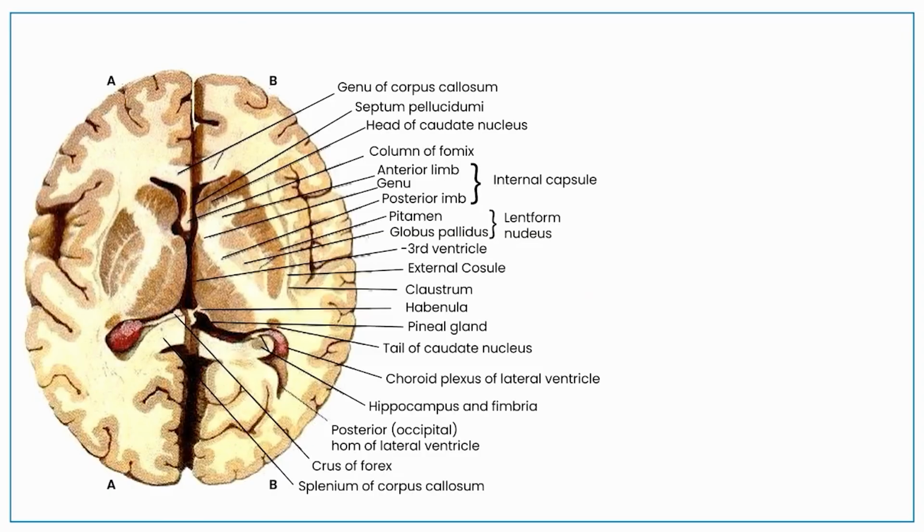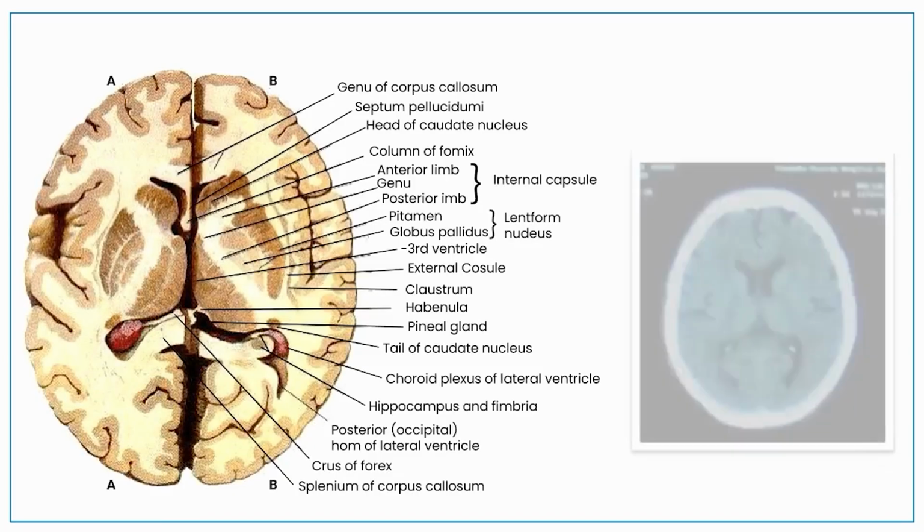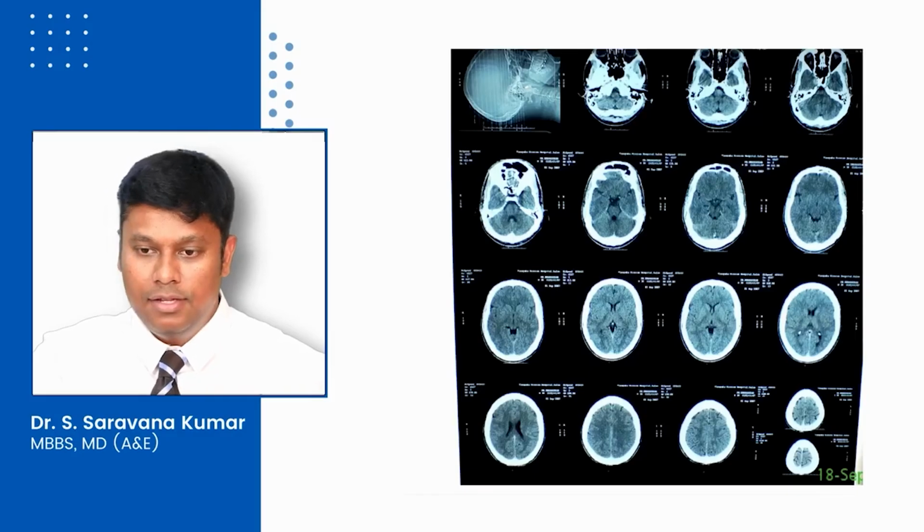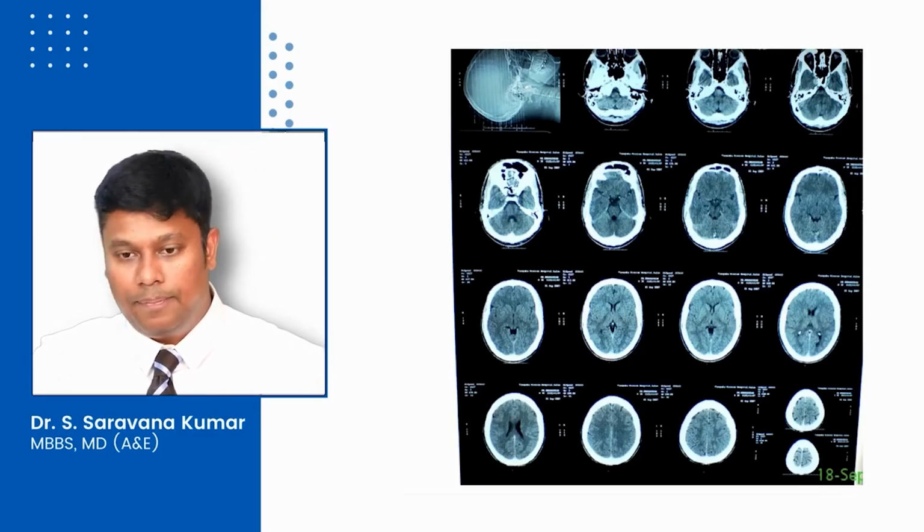As you pass through, you are going to come into the cerebrum proper, right? Here you can see the thalamus, internal capsule, lentiform nucleus. As we go up, you look at choroid plexus, that's where your CSF basically gets produced. So you have the posterior horn of the ventricle. These are your ventricles over the brain, which are quite easy to identify. I am sure most of you know how it's going to look. So let's come back and put it all together.